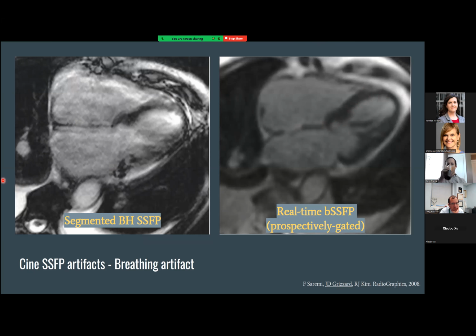So that's better, but we do have larger pixel size, and that can cause an overestimation of our end-systolic volume. And with an overestimation of the end-systolic volume, that could cause underestimations of both the stroke volume and the EF. So just something to be aware of if you are making those changes due to breathing artifacts, of which you'll often see the ripple paralleling the chest wall here. We need to make sure in our diagnostic calls that we're accounting for things like the underestimation of stroke volume and EF if it is a borderline case.